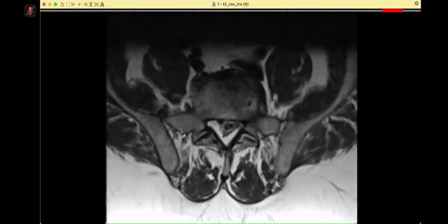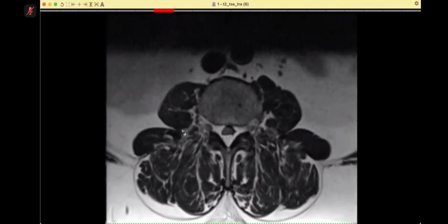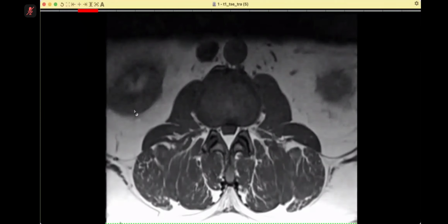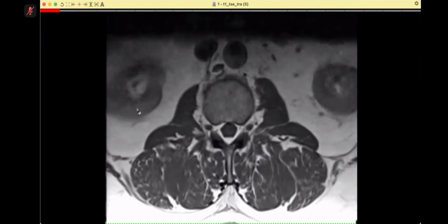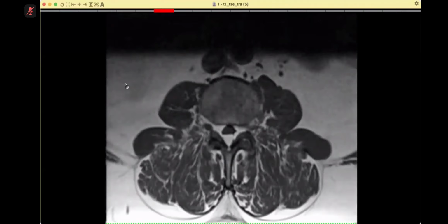Sir, Hint. I told you the patient has Cushing's. So can you show me the T1 once again? Yes, this is the T1. Okay. So if the patient has Cushing, can it be some hemorrhage into the cord? Right. Thank you.